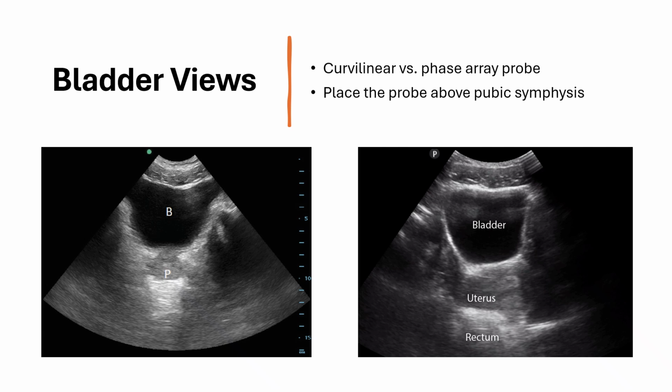It is important because sometimes free fluid or blood will tend to accumulate in the parabladder space or the space around the bladder. It can also directly suggest to you the volume status of the patient by looking at the amount of urine in the bladder, and also can help you understand whether the Foley catheter is properly positioned or not. Please take a moment to review this slide.